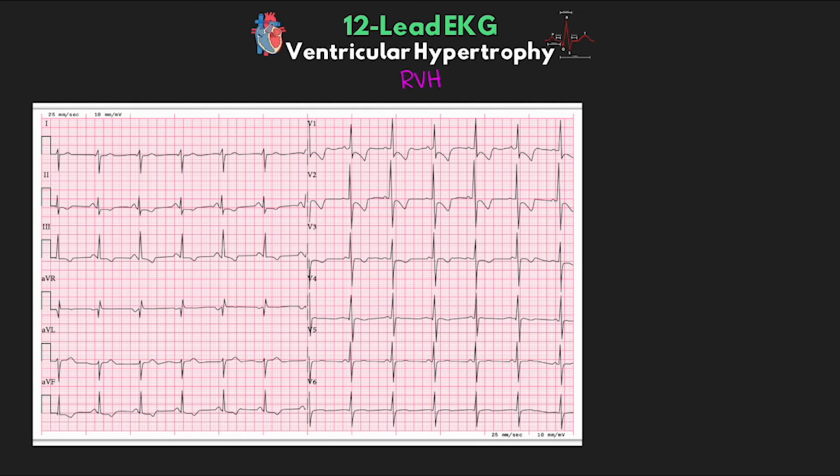All right, so here is our example EKG. When evaluating the EKG for right ventricular hypertrophy, remember first we want to look at our cardiac axis. This example isn't set up like how we normally expect to see them, nor does it show us the computer's interpreted numbers and all that. I will go through this real quick, but make sure you refer back to that lesson on cardiac axis if you need a refresher on this part. So we want to look for our most isoelectric line, which is going to be present here in aVR.